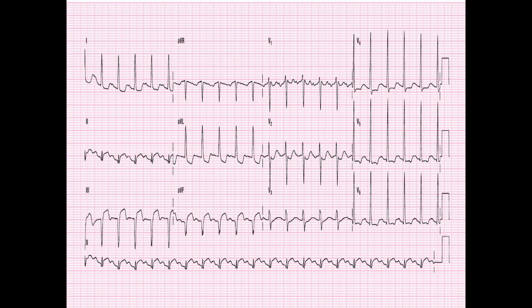And where do we see ischemia? So here we're seeing ST segment depression. Here I've got lead 1, I've got AVL, and I've got a V2. I've got it over here, V4, V5, V6, right? A little bit in V3, right? So I've got this ST segment depression into this flipped T wave. And we're going to call all of that ischemia.